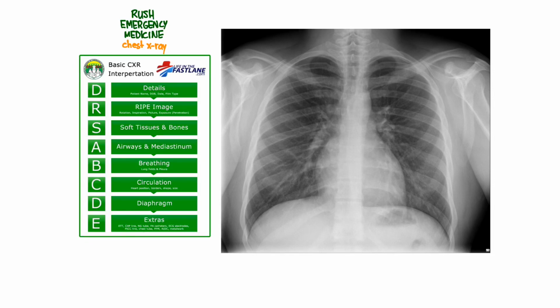Okay, welcome to the second video, and in this one we're going to talk about looking at a chest x-ray and having a systematic way for doing it. Now, the way that I learned it when I was in medical school was to do ABCDE, but I like this approach, which comes from lifeinthefastlane.com, which if you haven't seen this site, it's amazing. It has everything on it.